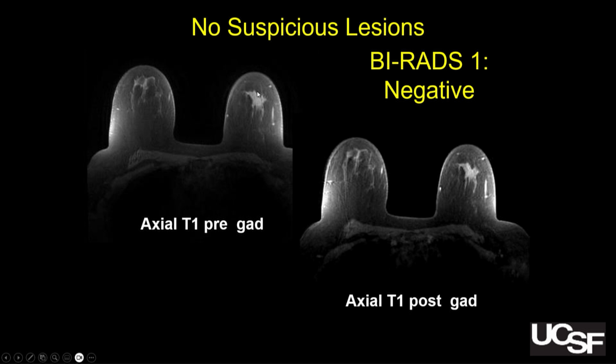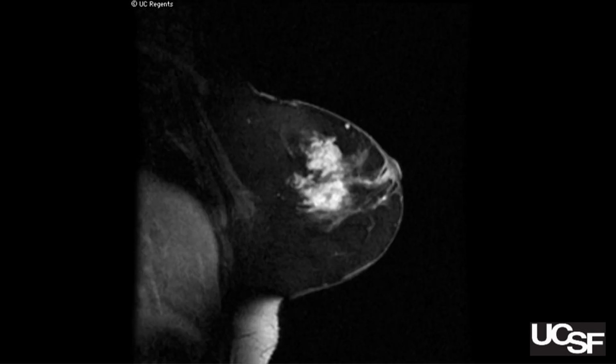If one were to draw a region of interest, a little ROI right there, and right there, you would see that there isn't any major change in signal intensity. So that would also prove it to yourself. It's not enhancing. So you always go back to what I call the source images, the pre and the post contrast series. The subtraction, the MIPs, those are nice shortcuts to highlight abnormalities, but always verify on the source. Okay. Case 4.